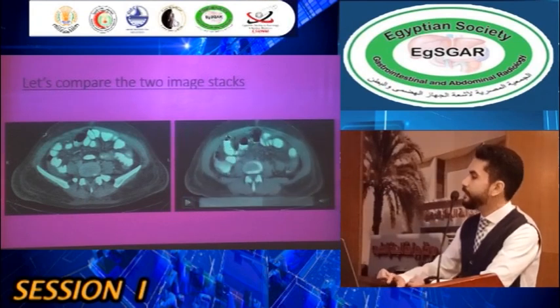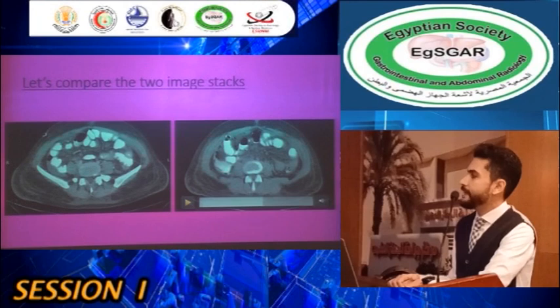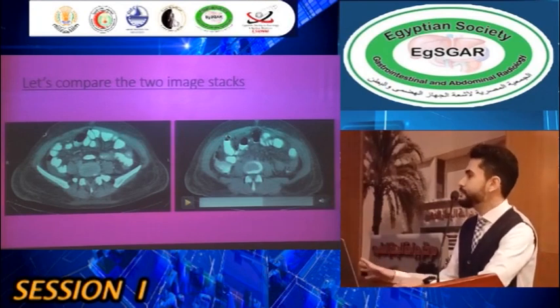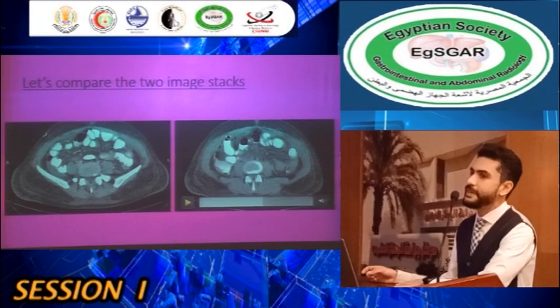So here we can see that this amount of fluid shows increased attenuation in the delayed images, and this denotes contrast extravasation. This case is quite common, and I bet that everyone here would be asked the same question by the surgeon: is there leakage or not? So this concludes the importance of delayed images in the imaging of post-operative cases.